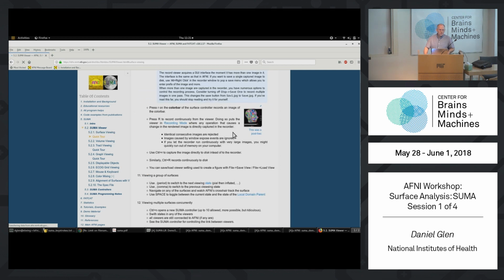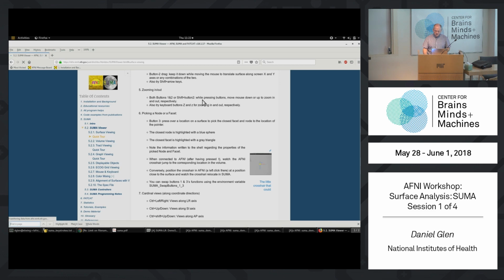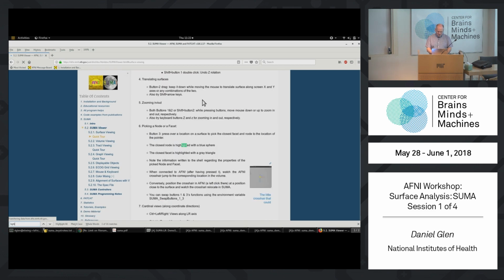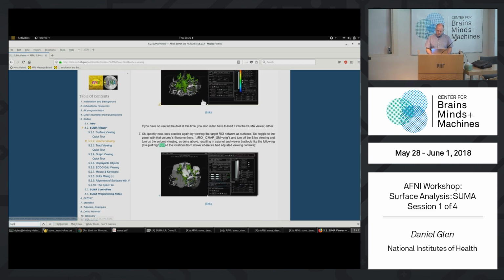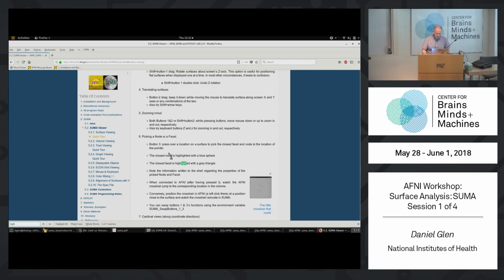Can you change the direction of light, brightness, shine? You can, and that's in the environment variables. Almost no one ever does this, but it is available. You can change the light. If you look for the light, we have some things that are available.